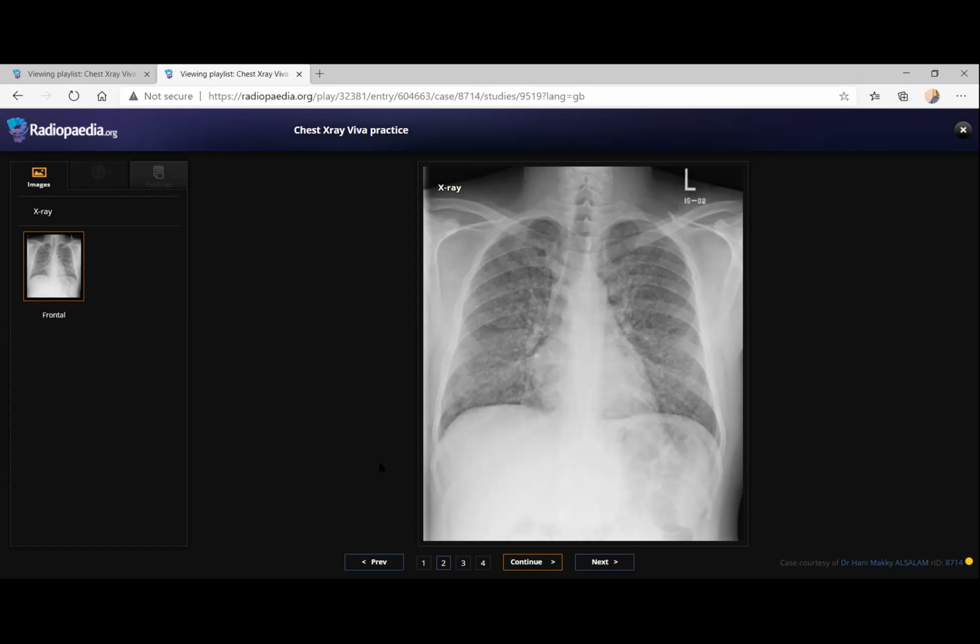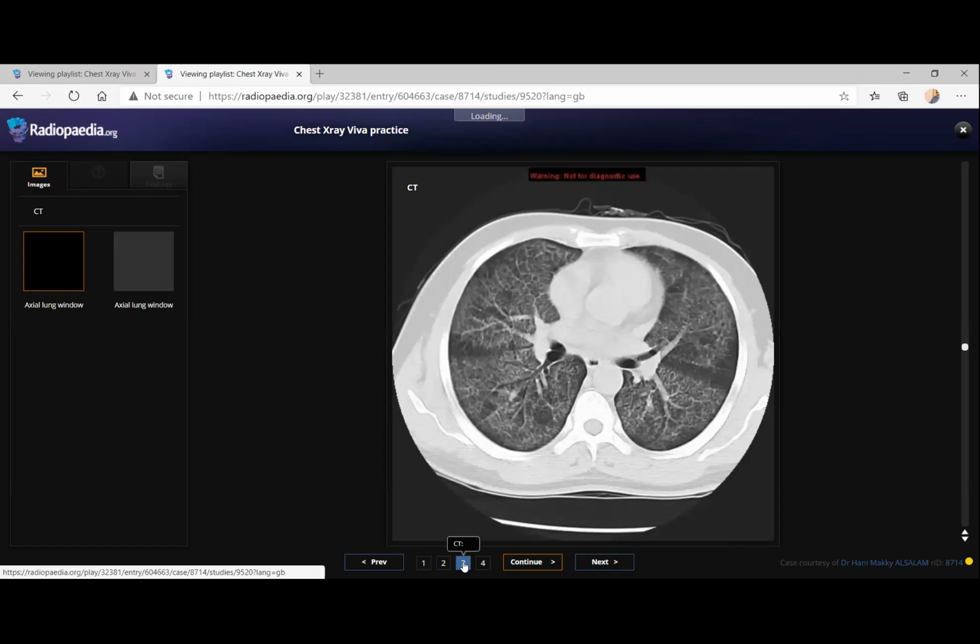Okay, so maybe it's a case of chronic interstitial pneumonia, for example. Is it an interstitial pattern or an alveolar pattern? I think it's more like an alveolar pattern. Can you change your DDs? I'm trying to recall the alveolar pattern involvement. So it could be a case of alveolar proteinosis, for example, anything which is infiltrating the alveoli, eosinophilic pneumonias.